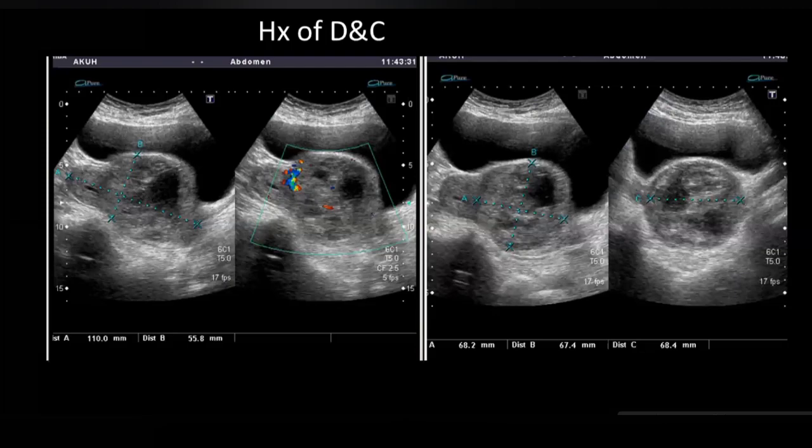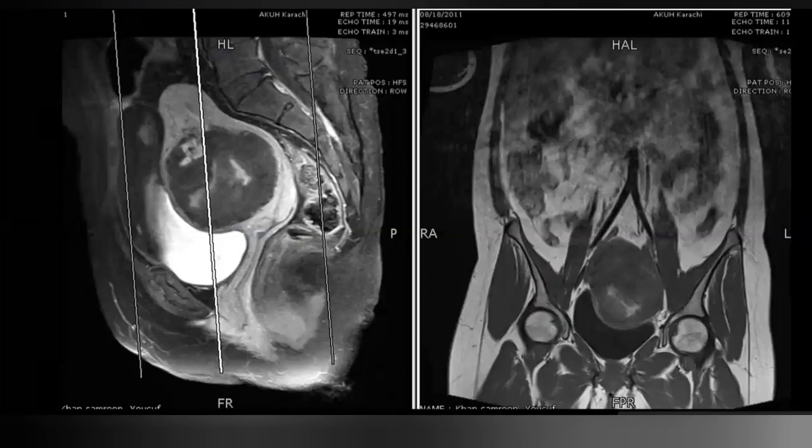We had no previous examination of the patient, and considering the history, the first differential is hematoma formation secondary to the procedure, and the second differential would be degeneration within a fibroid. This patient also underwent MRI examination, and as you can see, this did not enhance and was finally labeled as a hematoma.